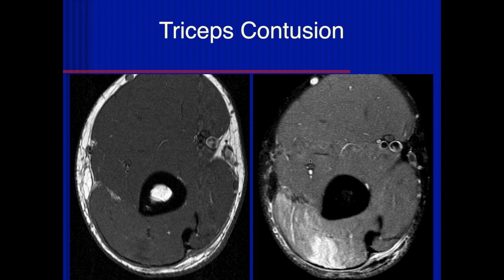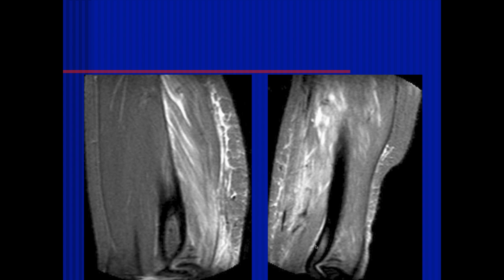Contusions like this tend to be kind of uniform in signal, like this, as opposed to this next case. Actually, what do you think's going on here?